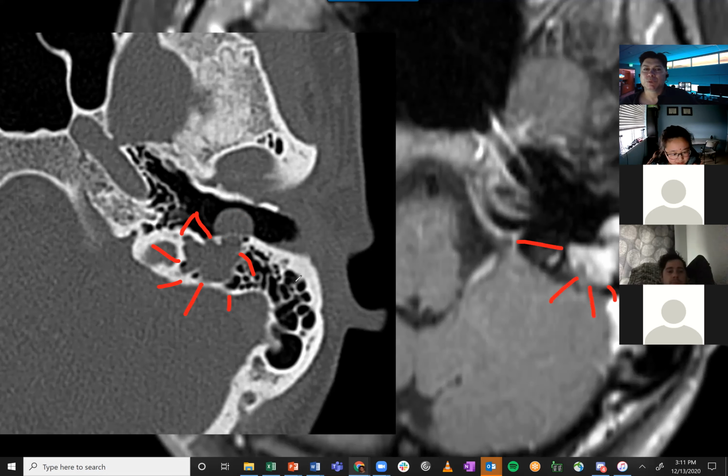Well, what do you think of the rest of the mastoid air cells? It looks very clean, so I'm not really liking it. Yeah, the rest don't look angry, do they? No. So maybe not an infectious inflammatory kind of thing, because the surrounding soft tissues don't look very angry about this. But it might be more likely for something to start here in the mastoids and then go into the EAC than for something to start in the EAC and go into those air cells.